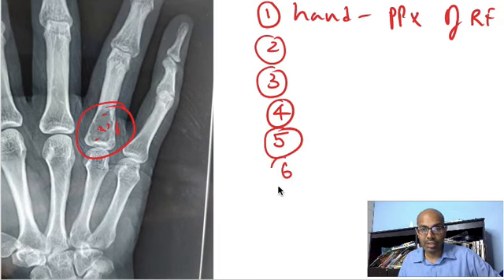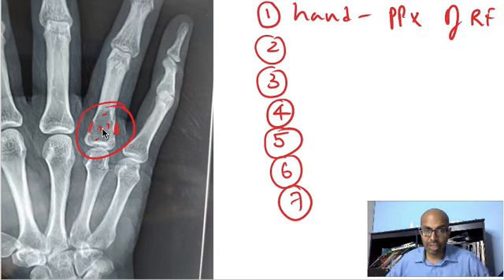The size is significant. It involves most of the bone, and there is some cortical thinning. What about the cortex? The cortex is thinned down on either side. So there is an imminent pathological fracture, or there might even be an undisplaced pathological fracture in this case. So what is the condition? It is Enchondroma. Enchondroma is the most common lesion that occurs in the metaphyseal region of the small bones of the hand. It is a chondrogenic tumor.